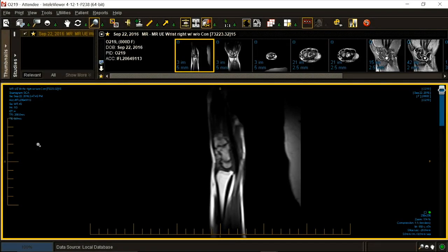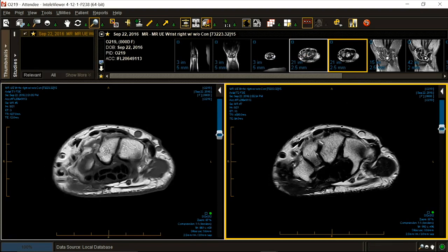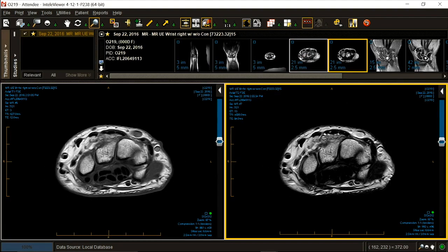Shall we do another? Long axis parallel views, critical for scaphoid evaluation. 55-year-old female, anterior right wrist mass for 1 to 2 years, increasing in size. So this time, anterior right wrist mass. I'm working alone. I'm working with one of my fellows. I put up the axials because it's a mass. Why do I like axials? Because I'm a classically trained radiologist and I'm used to cross-sectional imaging first.